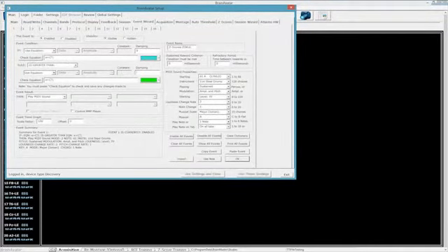So what I'm going to do is I'm going to change this back to 0. I'm going to change this back to this. And that's one of the reasons you do that.